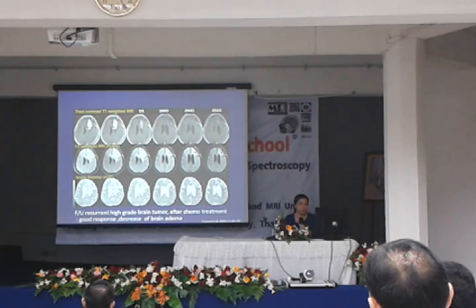And we can use DWI to follow up treatment of brain tumor also. In this case, there is a recurrent lesion after treatment. We saw bright enhancement in post-contrast imaging, and for ADC, we saw an area of the mass with restricted diffusion. When followed after treatment at 1 month, 2 months, and 4 months, the area of brain edema decreased and the tumor became smaller also, which determines response to treatment.